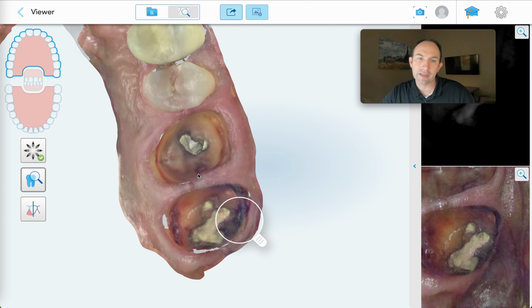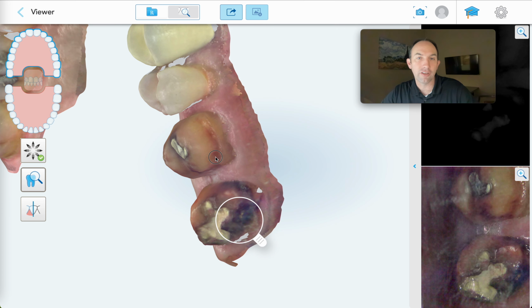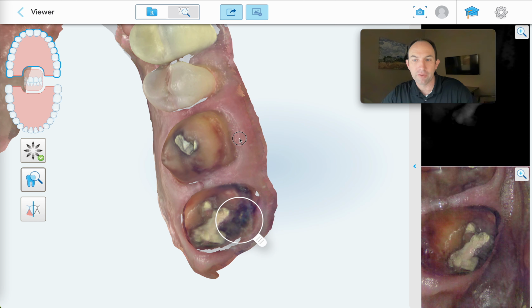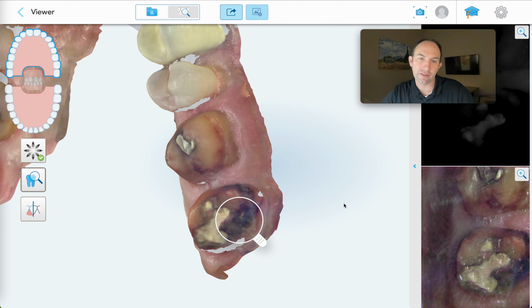fixable, sometimes a tooth dentin that has been soaked in saliva for years at a time may render the tooth to the point where it's just so soft we can't really do much to save it. So in this situation, you have to be very cautious with what you promise or commit to with the patient. We can't just tell the patient, yep, a crown is all it needs, or crown and core buildup, or crown and core buildup and root canal.